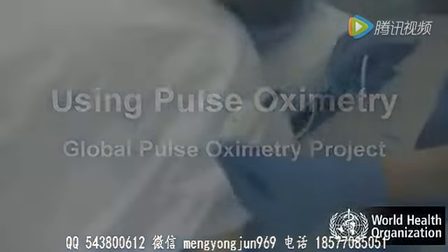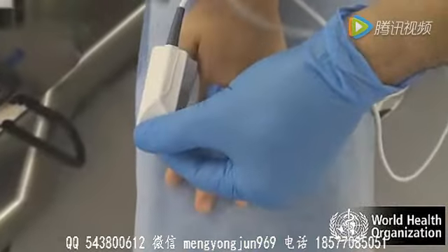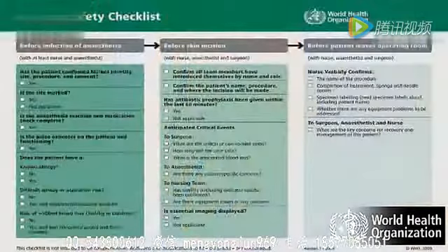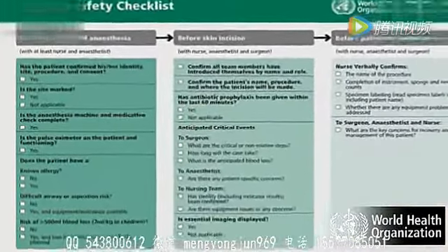Welcome to the World Health Organization Pulse Oximeter Instructional Video. The World Health Organization has recently introduced a surgical safety checklist as part of the Safe Surgery Saves Lives initiative.